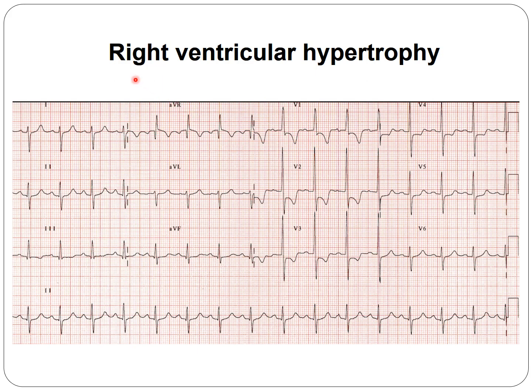In this ECG, we have rhythmic heartbeats. The rate is around 80. We have a P wave, a sinus P wave. The PR interval is normal. The QRS is narrow. And the axis is extremely right deviated. It's more than 120.